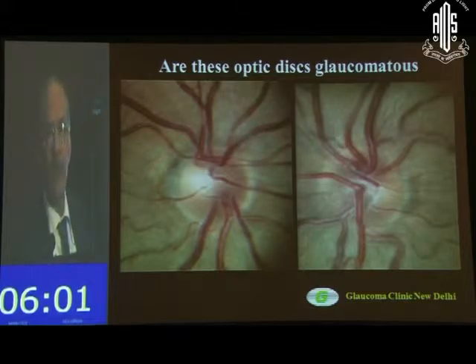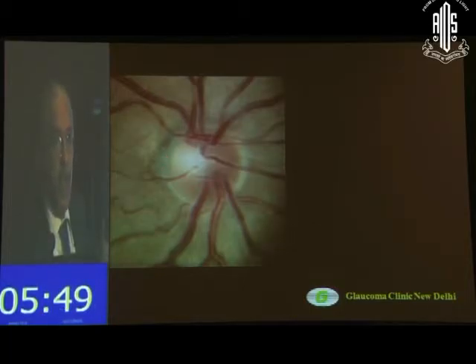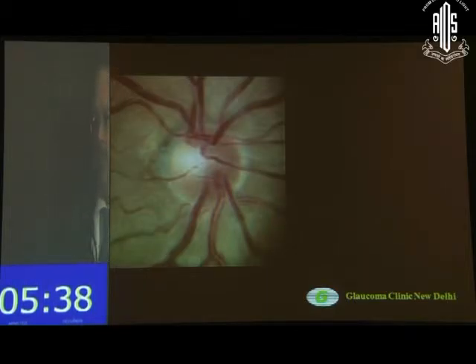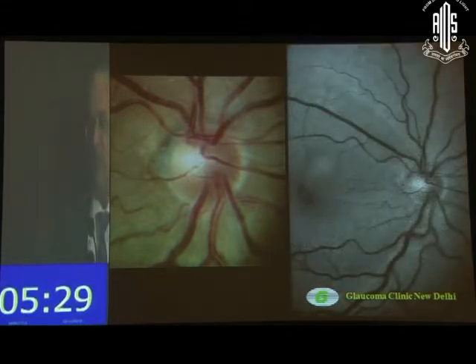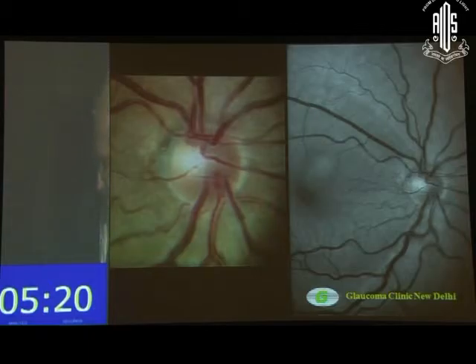Are these optic discs glaucomatous? No. Now if you look at the optic disc here, it's a small size optic disc, and a small size optic disc should have no cups. When we saw this patient, we got the fields done for the raised intraocular pressure as a part of our routine workup. We found that there was an inferior nasal depression consistent when we repeated the fields. Dilated and examined, felt it was still normal, and I'm actually showing you a mistake. There was a nerve fiber layer defect here correlating with the field change that we were seeing. I had missed it on my initial thorough examination.